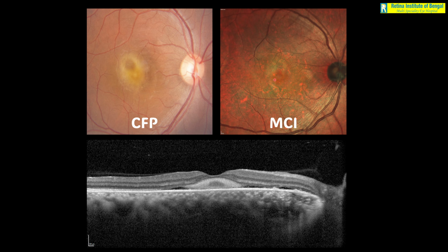This may be because of the infrared laser easily overcoming the fibrin. So therefore, unlike the white flashlight which probably got reflected from the fibrin, here the infrared laser went through and through, and therefore the machine could pick up that there was some elevation, which is represented by this greenish tinge here, but nothing else.